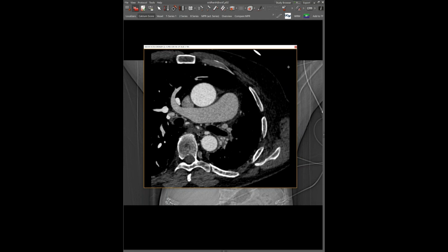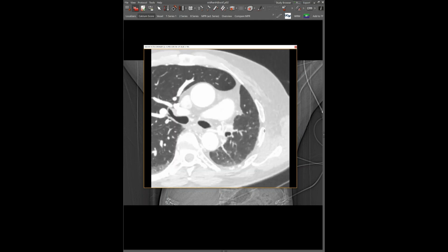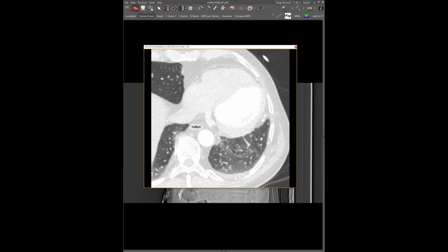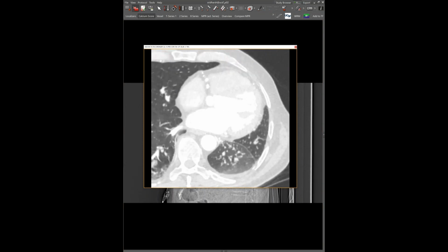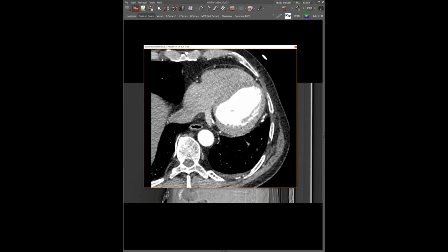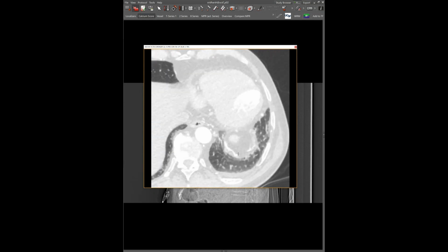That's really cool. What does the lung parenchyma look like? Yeah. If we take a look, if you look along the fissures, you see a bunch of what look like nodules, but I think those are a bunch of transpleural collaterals. Yeah, probably. They're really tiny, but there's lots of little vessels along here.